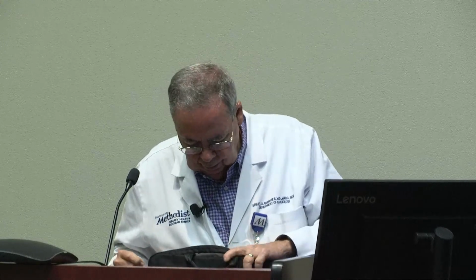There are some vendors, I think Philips specifically, which give an ejection fraction from strain. Are there any studies now? Is there something we should do? There are some manipulations of the curve that can potentially give you an EF. Personally, I have not tested any of them, so I defer an opinion on it. I don't know if we can trust them.